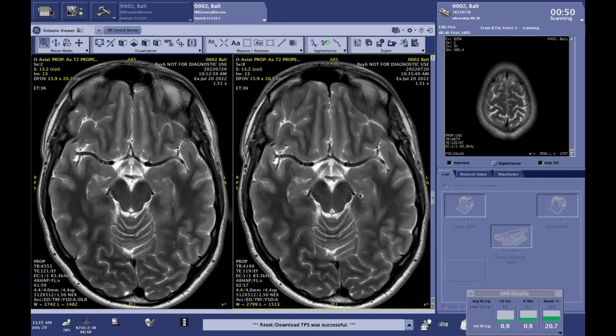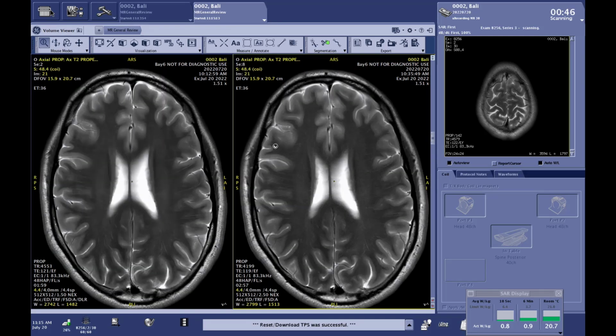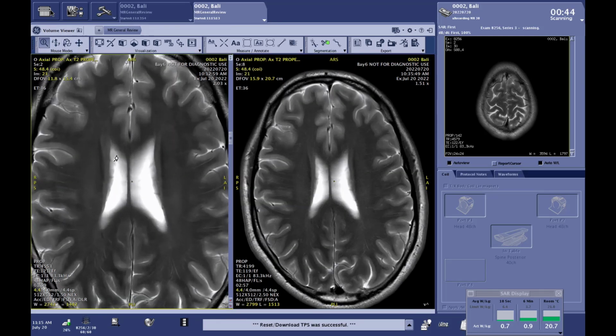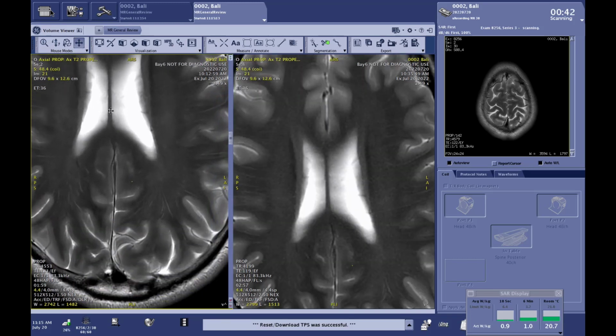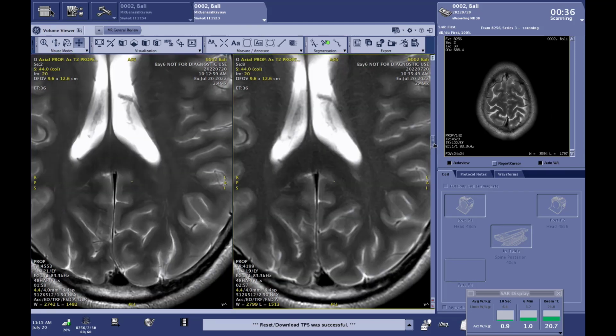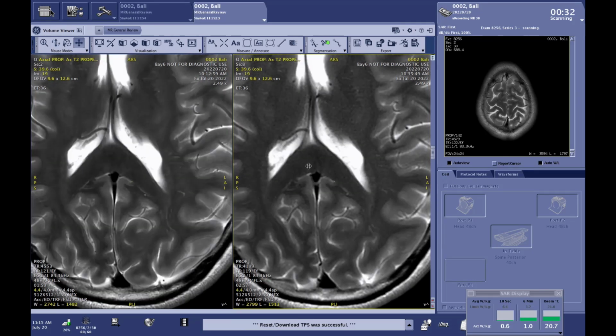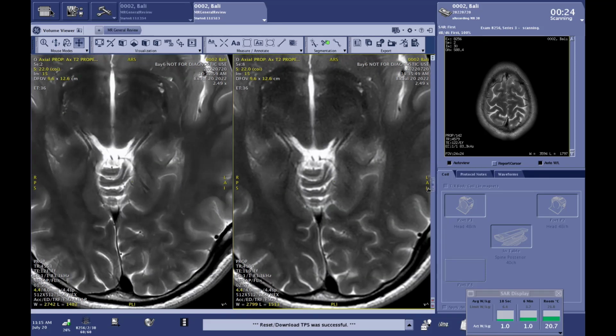You needed signal from somewhere, right? So you have to increase that. So without DL, that's what we're demonstrating here, the scan times are going to be much longer. So it's a great feature to be able to improve your throughput and improve your productivity. And I would still go with the image on the left-hand side, right? Even if adding a minute of scan time. So just the benefit of having Recon DL.